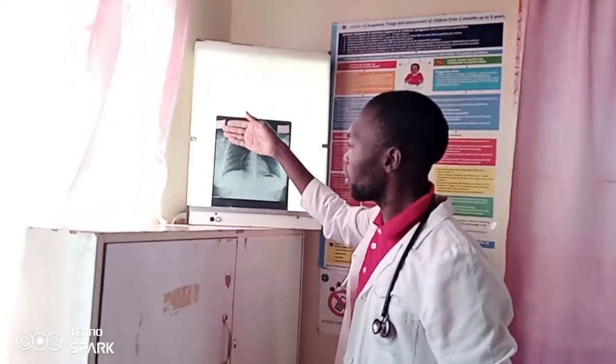So on X-ray we start from outer to inner. You start with the soft tissues for any injury, trauma, or any pathology you can see there. There is a systematic way of viewing an X-ray. You start from airway, A for airway. You check the trachea and also the lungs. The lungs are the darker part on X-ray, you see the air is black.